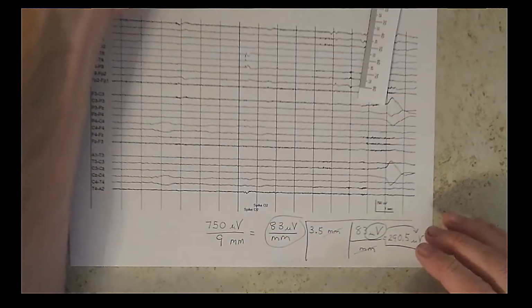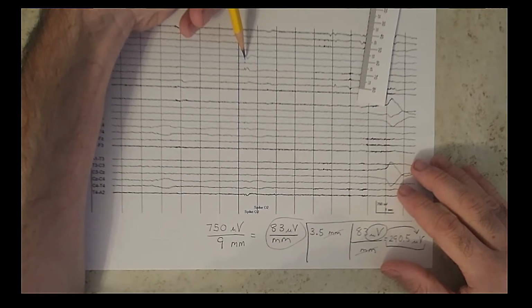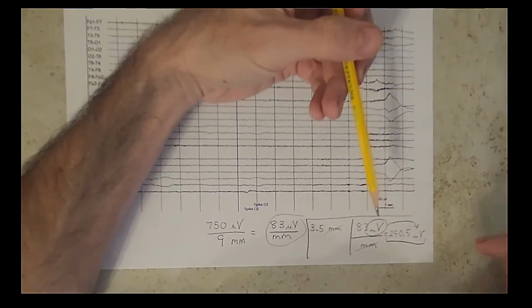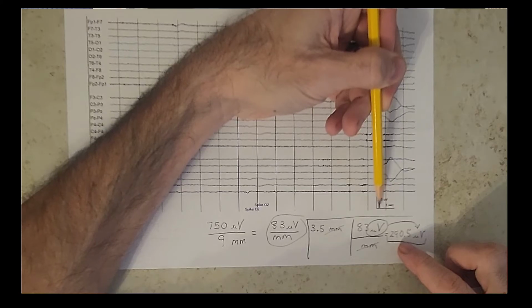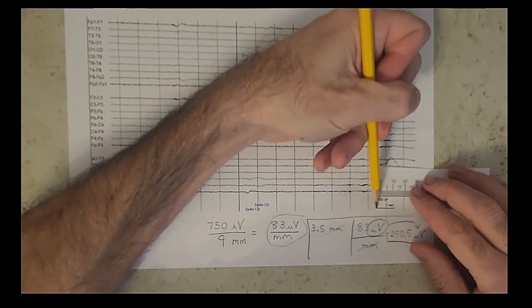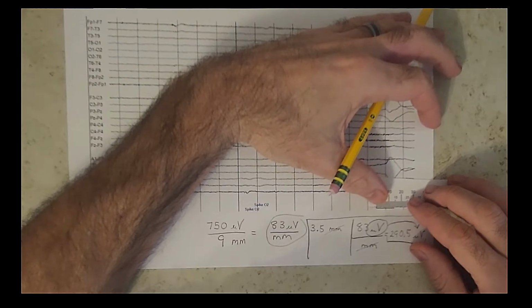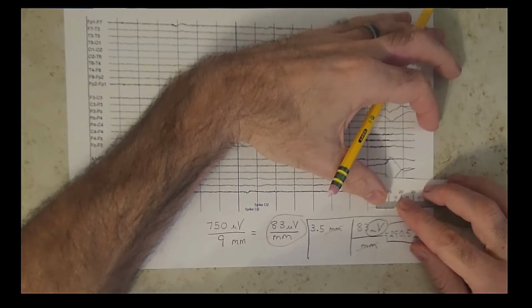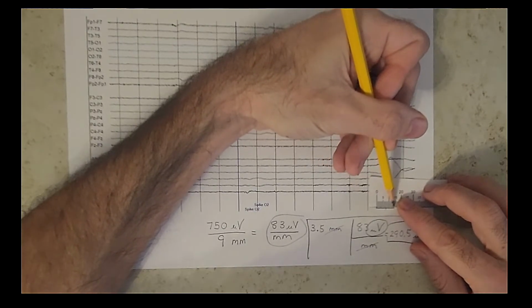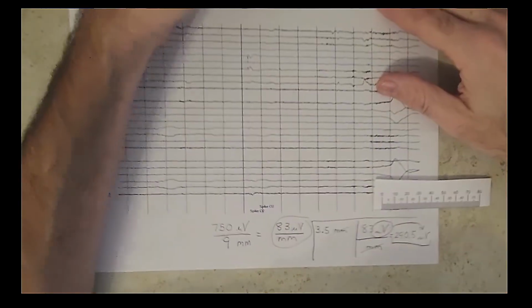What if we wanted to calculate the frequency of this spike, and just the spike component, not the aftergoing slow wave? Well, we're going to utilize our time base for that. And our time base is going to be calculated or derived from the horizontal component of the scale legend. So let's first do that. So we know that from here to here is 1 second. Let's measure how many millimeters that is with our ruler. And a good approximation that I get is 14.9 millimeters. Almost 15, but not quite. So we'll say 14.9 millimeters.